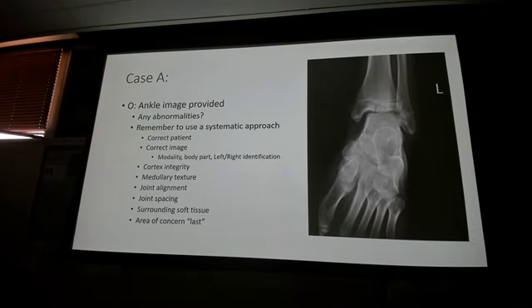Okay, so I got my x-ray. This is the part where I want you guys to do your thing. Give you a little while to go through it.